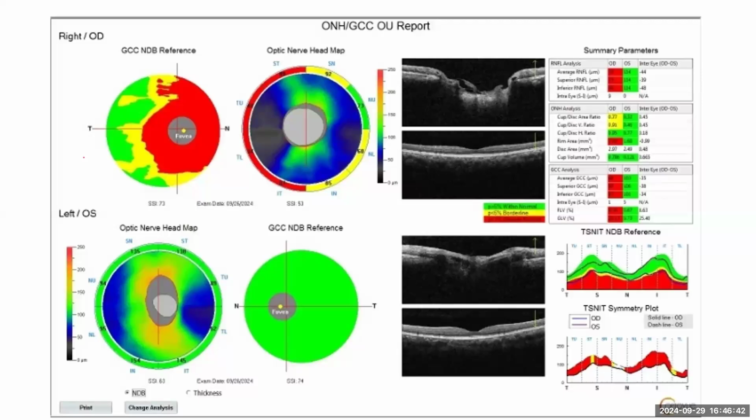This is an OCT of a patient. The patient is a 61-year-old female that has glaucoma. In her instance, it's an angle closure glaucoma. And then the right eye is more affected, with the nerve fiber layer losses depicted from the average retinal nerve fiber layer thickness and the color code here.